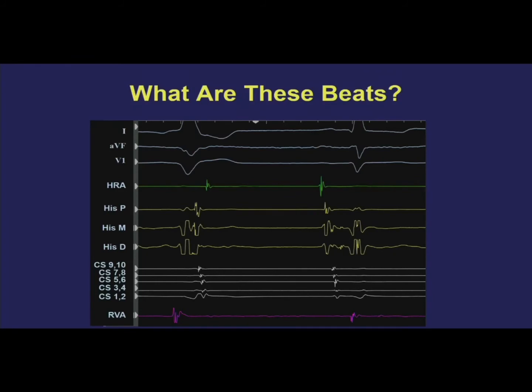So if you can say with certainty here that these are atrial signals, and you see them over here, they're atrial signals there. This gets especially important when atrial and ventricular signals are overlapping, like in AV node reentry, as we'll see tomorrow, like in a PVC that happens on top of a P wave, in those types of scenarios. So get used to figuring out what you know and then extrapolate to what you're not sure. So the fact that you see sharp signals here suggests A.